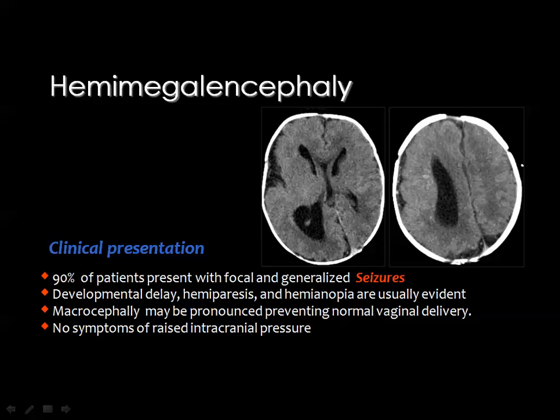And this is a hemimegalencephaly by CT affecting the right cerebral hemisphere. The right lateral ventricle is large and the frontal horn of the ventricle is straightened. There are thickening and broadening of the gyri, and you can also see few cortical sulci on the surface of the cerebral hemisphere. You should remember that the most important presenting symptom in all this group of diseases is seizure.